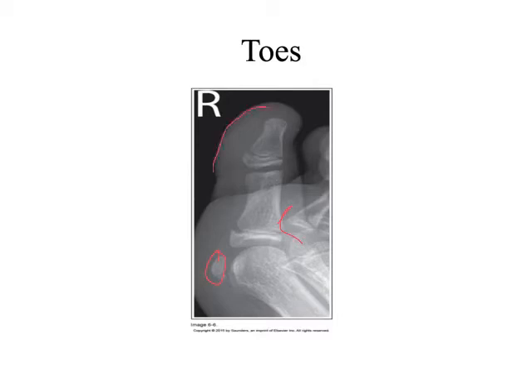Look at the soft tissue. There's more soft tissue here than over here, right? So I know that. In addition to that, typically you would see that kind of hourglass shape up here, but I see more of an hourglass on one side than on the other, right? So I know I'm approaching a lateral or an oblique position.